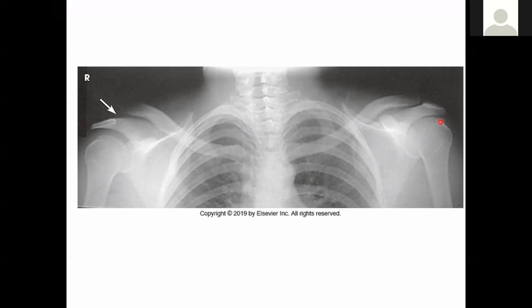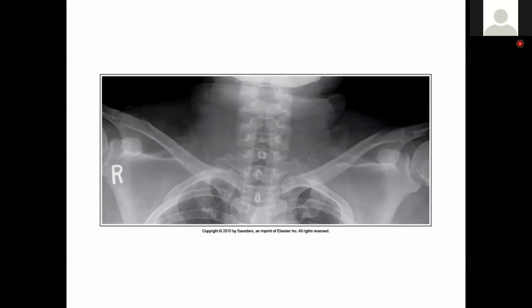Coracoid, acromion, humeral heads. Note quite a difference in separation on the right side versus the left. Another AC joint image. You may think that we've clipped off anatomy because we don't have all of our acromions visible, but the joints are visible. But this is a case where a little bit more SID might help to see things a bit more clearly.